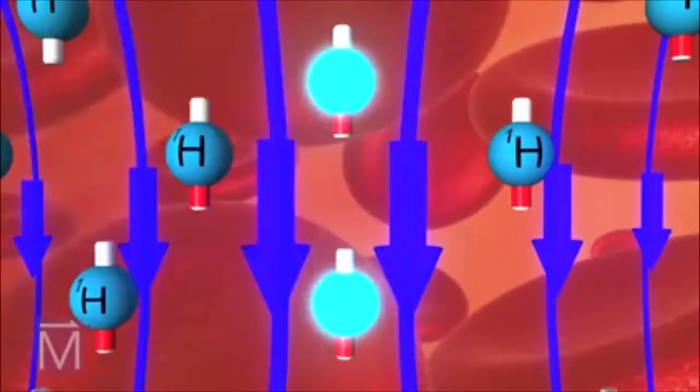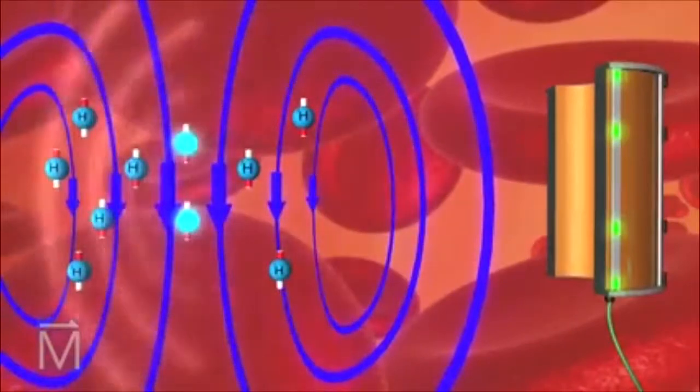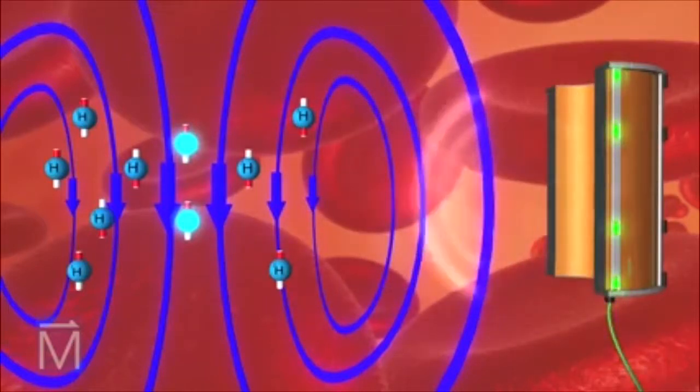When the RF pulse stops, the protons release that absorbed energy, return to their previous alignments, and, in so doing, emit a signal back to the coil. Let's watch this one more time.